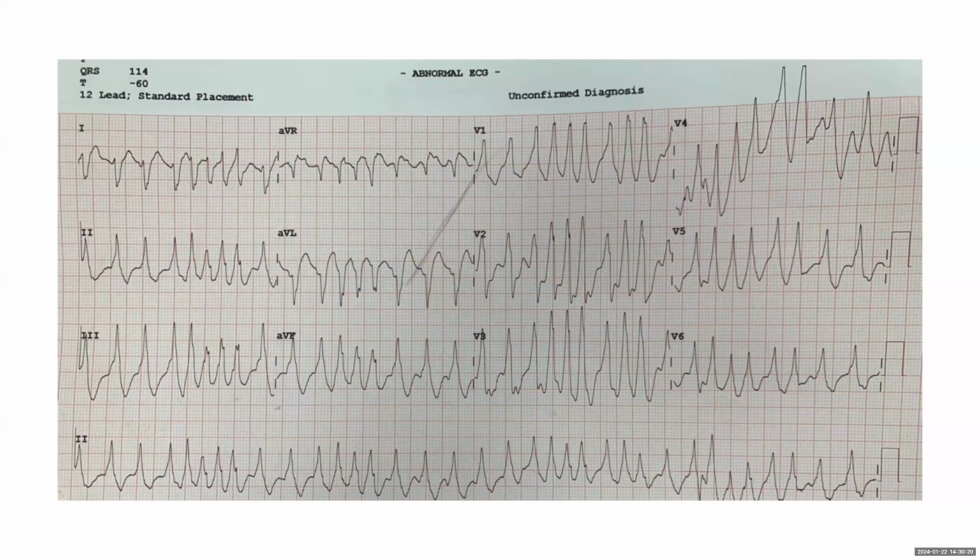Is there AV dissociation here? AVD means AV dissociation? There is no AV dissociation because the atrium is in atrial fibrillation. Right? So atrial fibrillation is just chaos in the atrium. And the fact that you're saying it's conducted pre-excited AFib means it's associated.